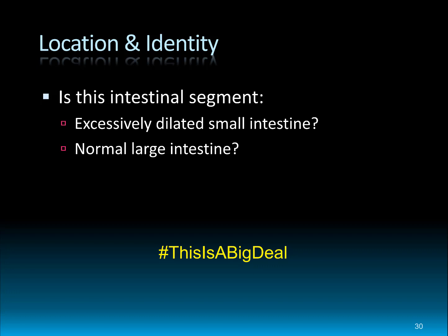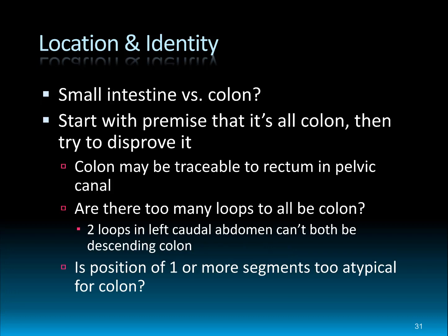be, we have to decide if a given segment, especially if it's big, is excessively dilated small intestine or potentially normal large intestinal segment. And that's going to be really important as we try to decide if a patient may or may not have an intestinal obstruction.